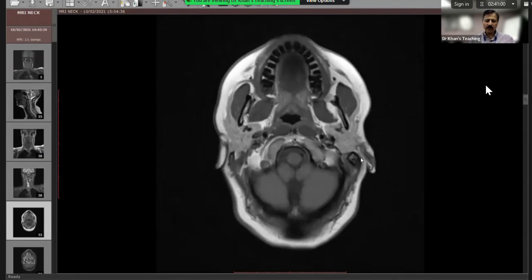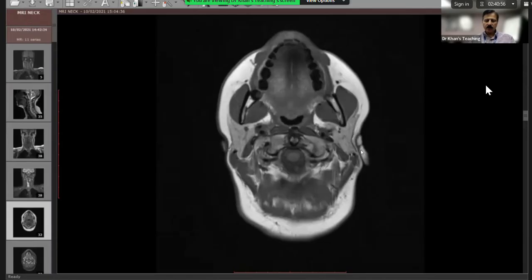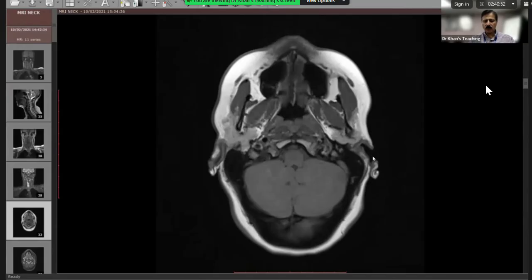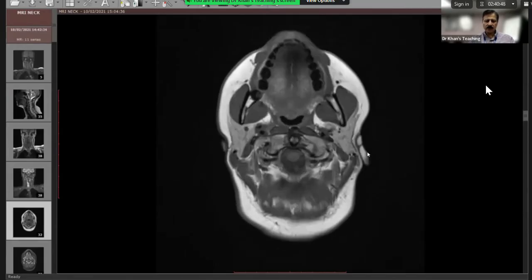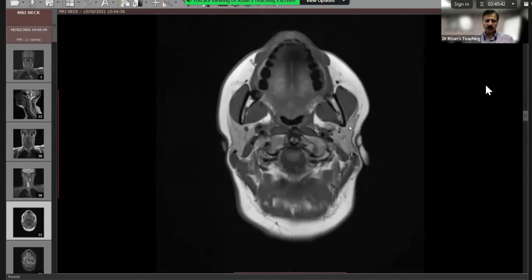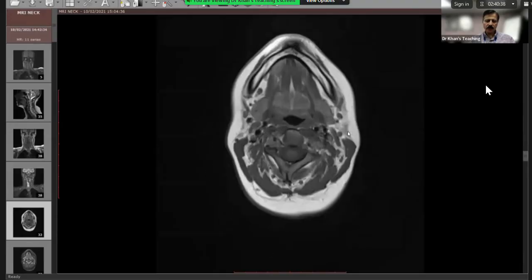And we have done this anatomy on temporal bone in the first session. And posterior to that, of course, this is the external auditory canal, etc. So in conclusion, around the mandible, here is the masticator space, and posteriorly is the parotid space.